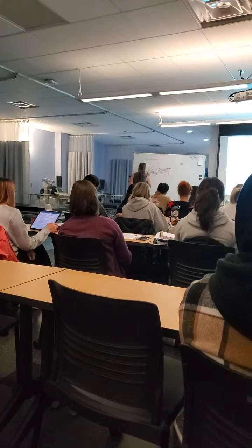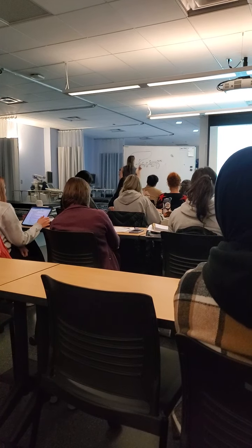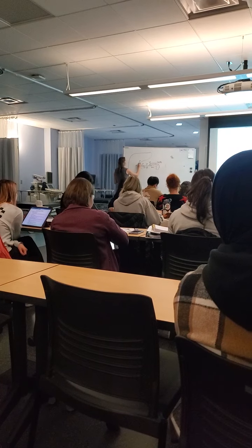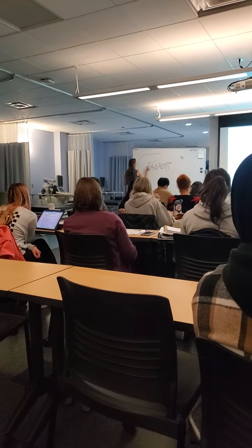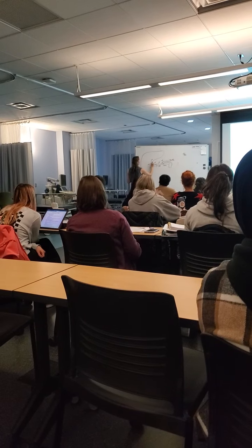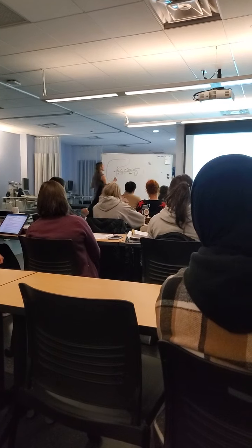So here's kind of that main portal vein. It's going to enter the liver as well. Remember our portal triad, your best friends. So just as this is going to bifurcate into the left hepatic and right hepatic, we're going to have that right portal and that left portal following that same course. So they live together even at the microscopic level.